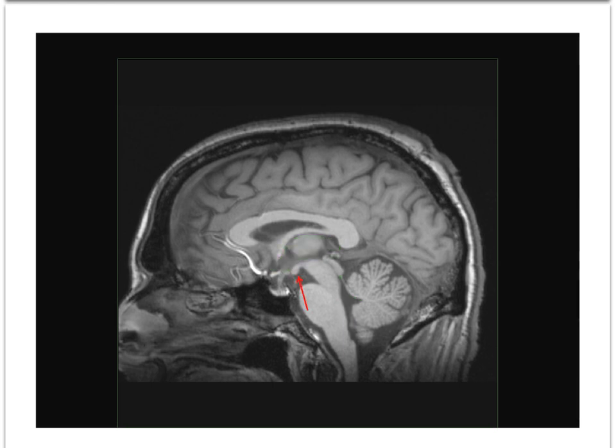This arrow points out the mammillary bodies, which are paired round structures in the roof of the interpeduncular cistern. And here we point out the interpeduncular cistern. This midline structure that extends from hypothalamus to insert on the pituitary gland is the infundibulum. And this is the pituitary gland within the sella turcica.